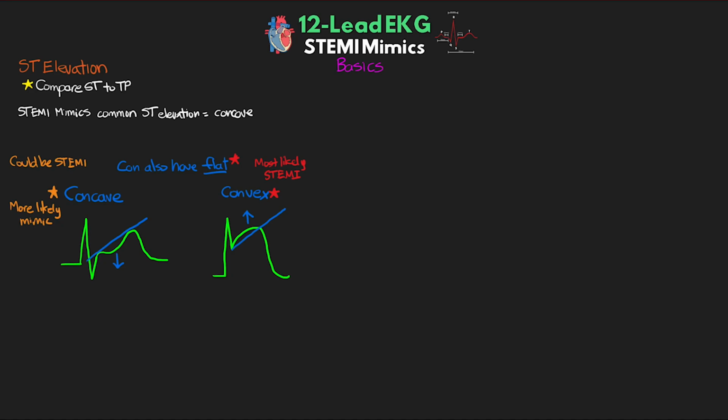And so this actually leads perfectly into the next point that I'm going to make, is that remember, with each 12-lead EKG that we perform, there's a real patient associated with that EKG. Now this seems obvious, but I mention this because remember that we want to correlate what we're seeing on the 12-lead to our patient that is in front of us. Our physical assessment of the actual patient can tell us a lot, and we need to remember to take all that into consideration when we're evaluating anything going on with our patient's EKG, especially ST elevation. I'll dive a little further into this with these mimics when I talk about them.